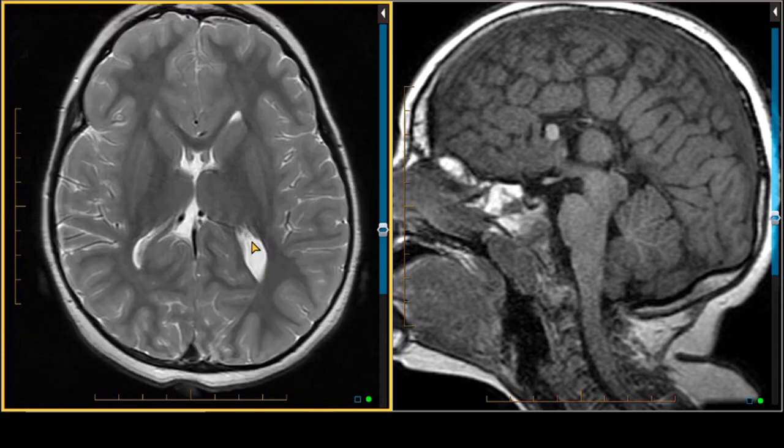Now, this is not a true agenesis of the corpus callosum, because if we look here, we actually see some midline commissural fibers in a portion of the corpus callosum. If we go back to the mid-sagittal image, we see a very, very small area. So this is not complete agenesis of the corpus callosum, which means complete absence, but this is definitely a very severe dysgenesis or abnormal development of the corpus callosum. In terms of other commissural fibers, we see a small anterior commissure right here. Otherwise, all the other features of agenesis of the corpus callosum seem present.